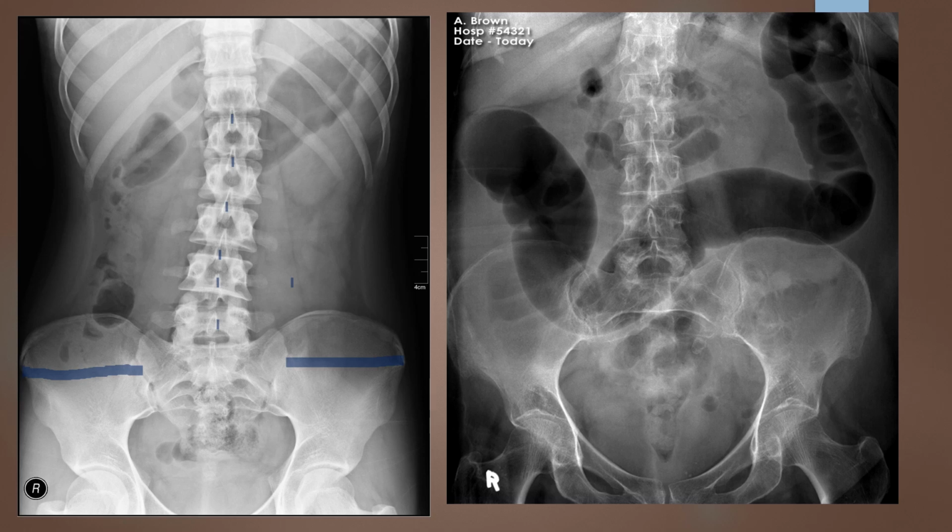Okay, then I'm looking for mid-sagittal rotation. We already looked at that very carefully. We're looking now for mid-sagittal tilt. If it was tilted, I would expect it to be going off at an angle off of my image receptor, but it does look like it's nice and aligned. So I'm going to say this looks good. So the image itself really does look good. It's just they clipped the anatomy, so they're going to have to come back and repeat the two images, or add the two images to help complete this exam.